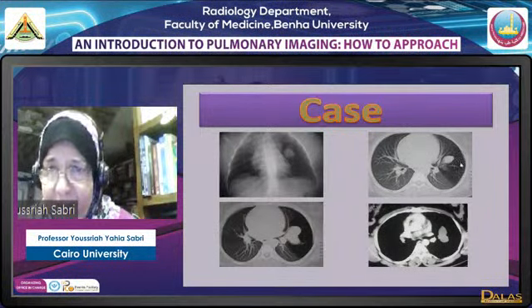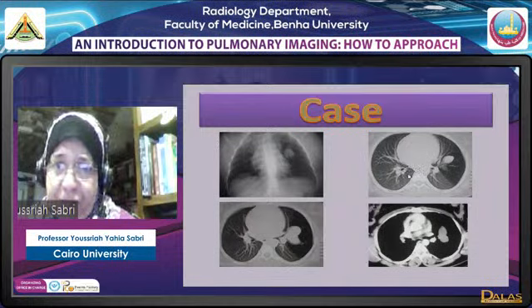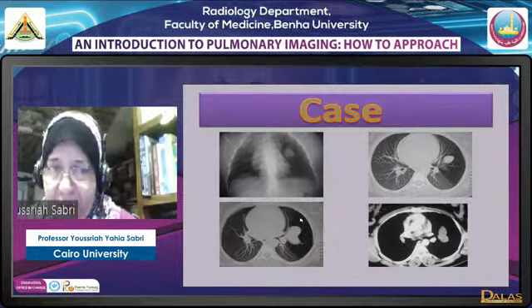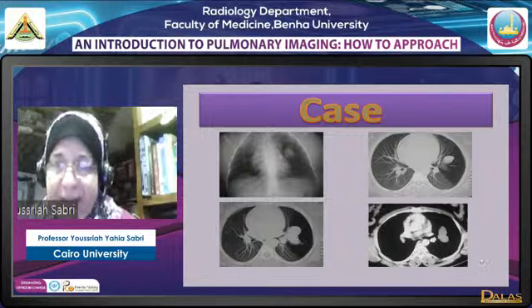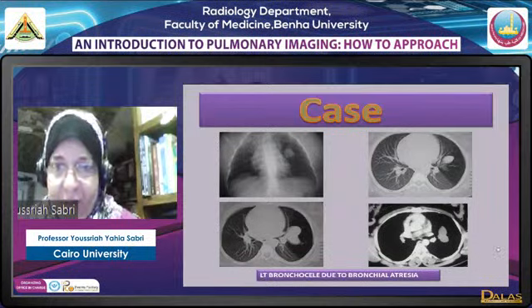We see that this oligemia is surrounded by compression of adjacent structures and contralateral shift of the heart. If you look at the heart here, it's slightly shifted to the right, so there is a mass effect in this hyperlucency. This is air trapping. So we have a lesion with distal air trapping, and in the mediastinal window we see hypodensity, fluid density. This appearance is typical for a bronchocele due to bronchial atresia. Spot diagnosis.